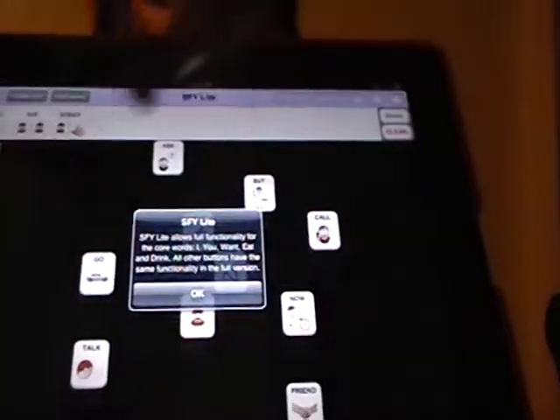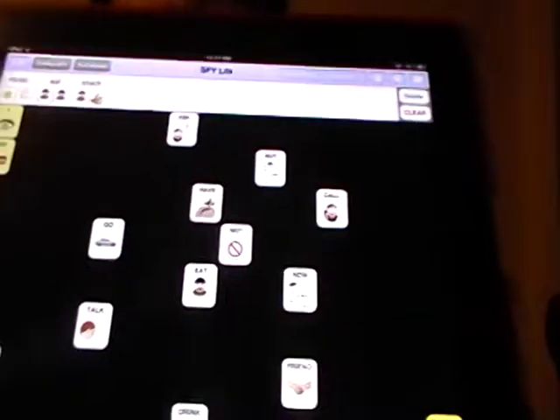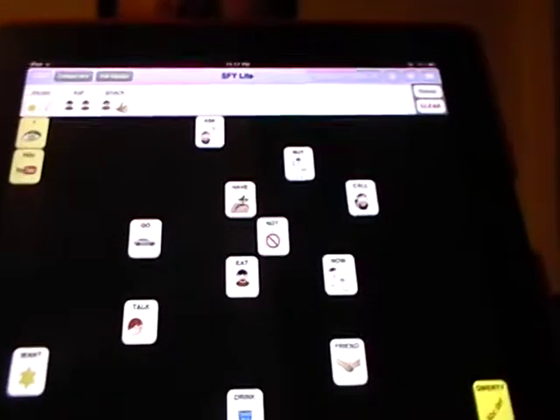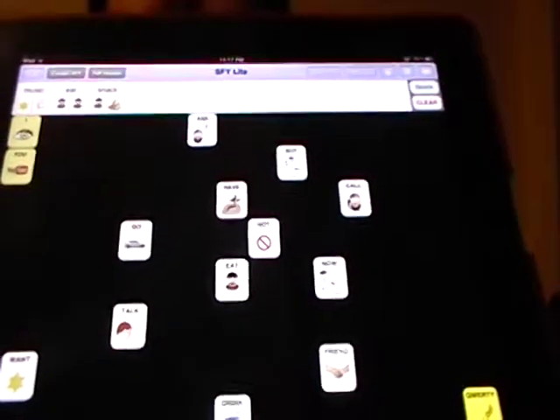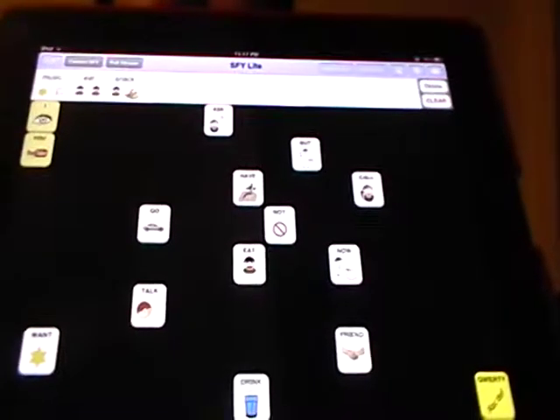So, if you don't want the child to keep hitting buttons here that are then getting flagged with that warning, but just if you did want to add some things and see if they could still pick out if they were really enjoying the snack they were eating, or if they really wanted you to keep squeezing them or running or tickling or playing music, whatever it was that you found was motivating for them. You could open everything up and see if they're able to still locate where it is.